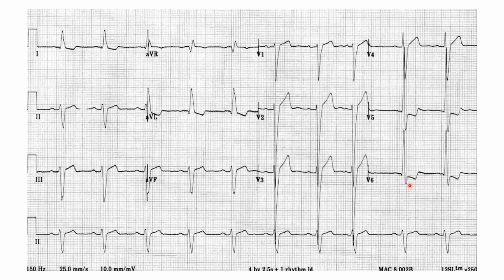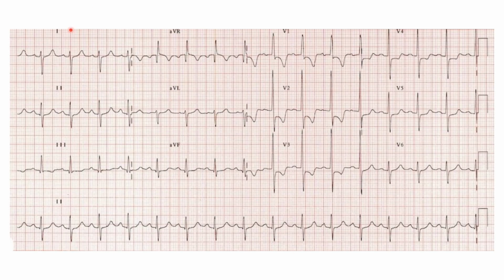So now let's look at an example of an ECG in a patient with right ventricular hypertrophy. Remember that right ventricular hypertrophy could be caused by pulmonary hypertension, where we have increased afterload, which the right ventricle has to overcome to maintain the cardiac output, and this is going to put lots of stress on that right ventricle, leading to hypertrophy.